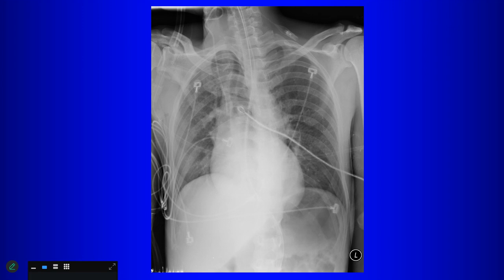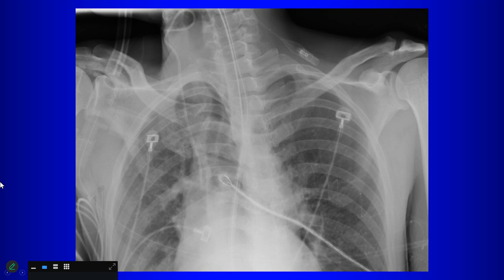Okay, so if we look at the lines for a second, right? I think we've got the right central venous catheter, right jugular guided. Is it a little bit curled up top? The central venous catheter? Yes. You see it superior. All right, I'll give you a close-up. The ET tube is too, like. Where's the ET tube? Not overlying the trachea. It's in the esophagus. Yeah. Here's the trachea. The endotracheal tube is in the esophagus.